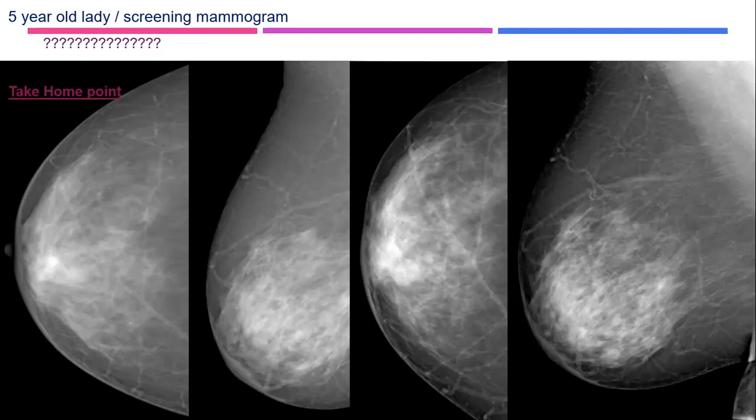I think yes. We said that if you see a mass on a single view, you will call it an asymmetry until it proves all criteria to be visualized in the two views. If you could not appreciate it, you will still call it an asymmetry, even if it looks like a mass.